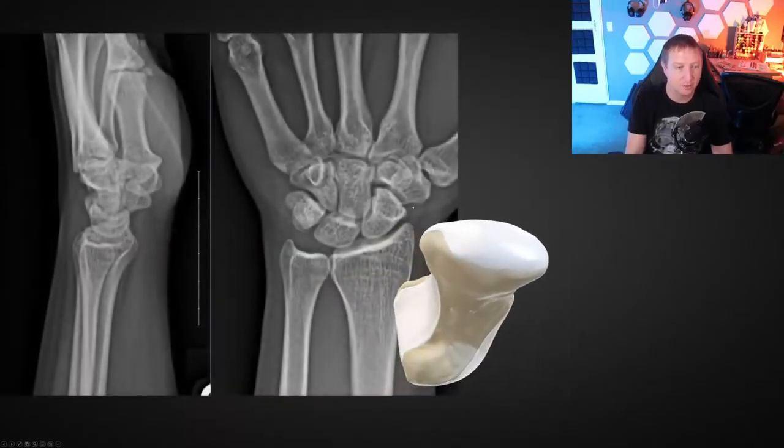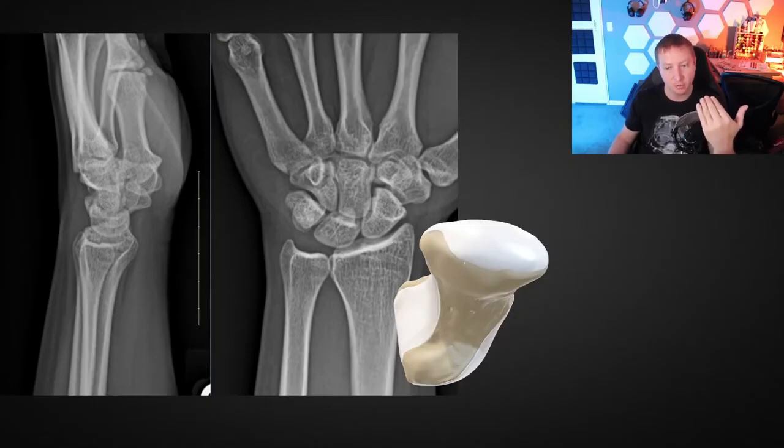All right. So let's talk a bit more about this scaphoid and how foreshortened it is because of that tilt. You can see in this case, I've rotated it so it's tipped towards us. We can make out the under surface of the distal pole here, and that can project across the waist of the scaphoid, and that's just because of the tilt. If we look at the lateral view here, we can see how tilted this is, right? I'm just going to roughly outline the contour of it. You can see that it's almost at a 45-degree angle. Because of that, we're going to see the proximal pole project out here, almost looking like it's coming out of the waist. So that's what it's going to look like. You may see this ring-shaped structure.